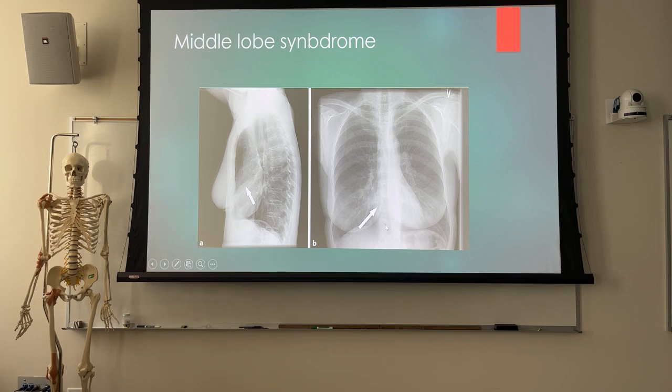So on the AP, again, just kind of driving the point home, on that right lung, it looks like that's where the arrow was pointing to. The pathology is in the lower portion of the lung, in the lower lobe. And then if you look at the lateral, then it makes it a little bit more clear. That's probably maybe the lower portion of the middle lobe, right? And this illustrates what I was talking about on that posterior costophrenic angle. You got the obvious diaphragm, costophrenic angle, but you see the lung markings back there. You kind of see those little squiggly lines back there?